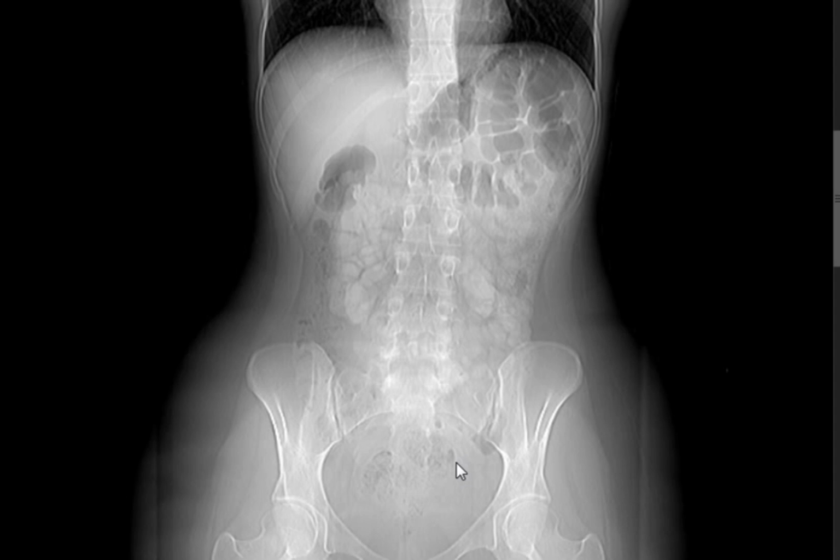Well, so this is a case of a young adult female patient. I think she's around 20-something years old, presented with repeated vomiting and upper abdominal pain. I mean, interrupted attacks of vomiting and upper abdominal pain, then normal, and so on. The ultrasound was normal and she did not respond to treatment, so a CT scan was ordered for her. 20-something years old, 22, 23, something like that.